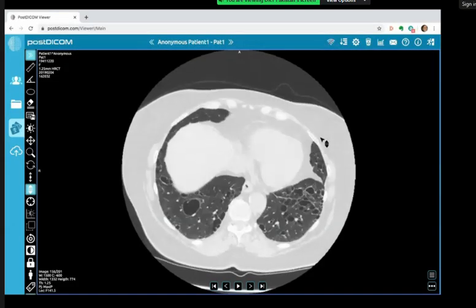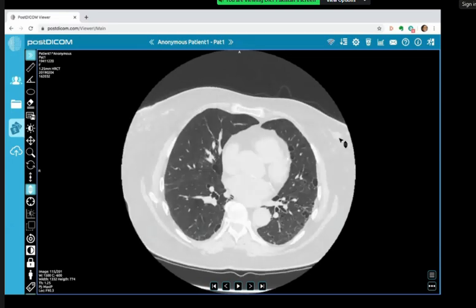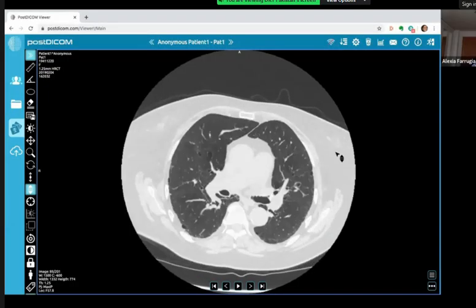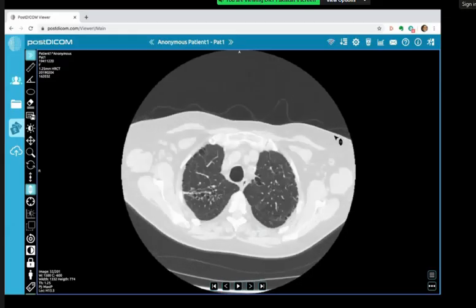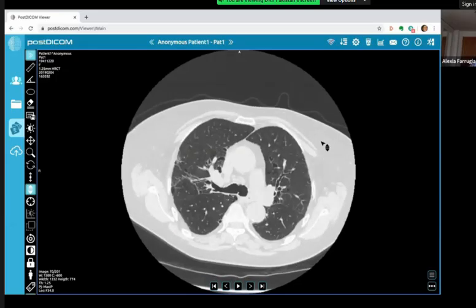I was considering whether it might be LAM, but with that you'd expect there to be a chylothorax or something. And this would be more uniformly distributed, isn't it? Yes. Throughout the lungs. So this lady had LIP, lymphocytic interstitial pneumonia. Right. Which we do see in Sjogren's syndrome.